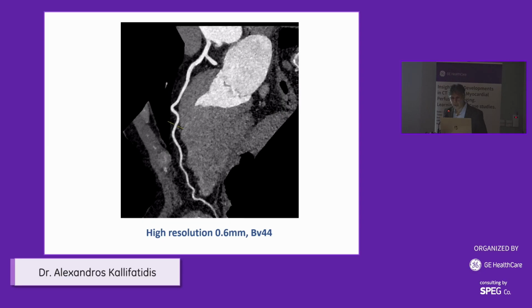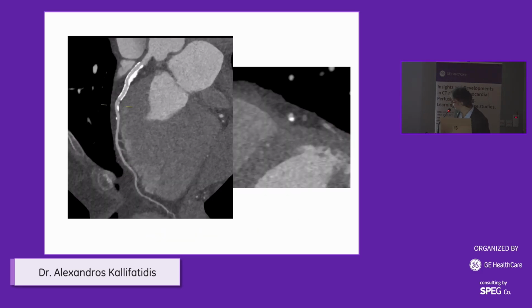It is important, especially when we have a lot of calcification or stents, to have high resolution reconstruction with sharper kernels like this, in this case, or in this case that we see nicely the stent. Here is a calcified plaque. I think that we can appreciate this decrease in the blooming artifact that calcium can produce, and we can nicely assess the lumen.